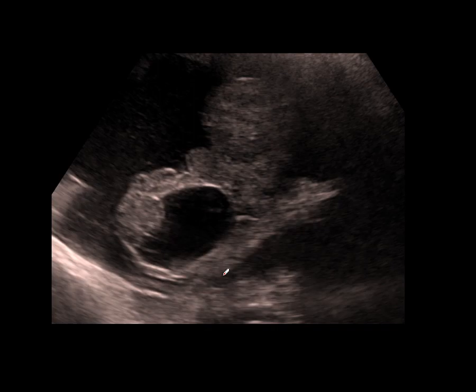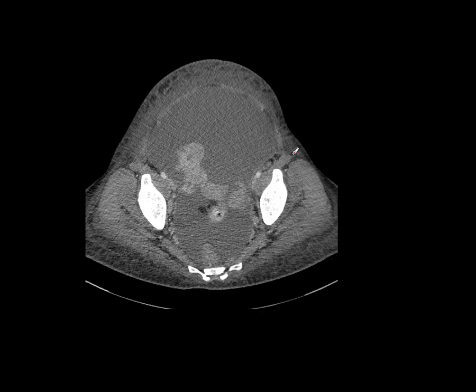Think about the last patient. I think this lady was probably just in her late 40s. You can see clearly there's a very irregular margin, lobulated contour to this ovary. So this is malignant tumour here. Here's our CT scan. You can see that malignant tumour of the ovary with ascites.